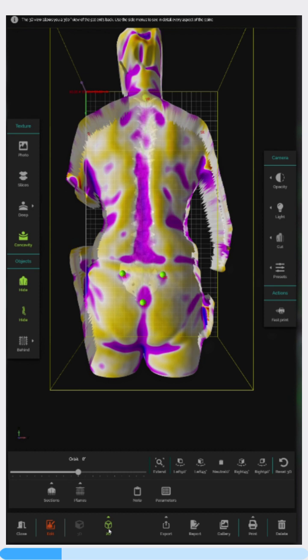Sometimes this data is overwhelming for the patient to interpret. So effectively, it can be described like a topography map of a mountain range, with the valleys being a deeper, darker colour, such as the purple, and the mountain tops being the lighter yellows and whites. And therefore you can actually see whether that spine has normal contours, whether the muscles are bulging, or there's rotational components, or even muscle wastage when looking at the glutes, paraspinals, etc.